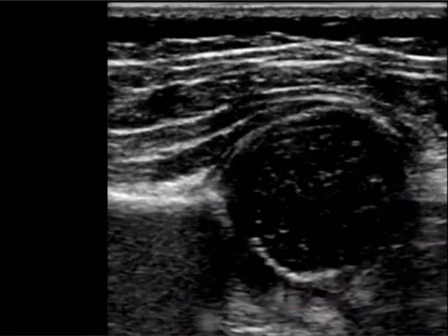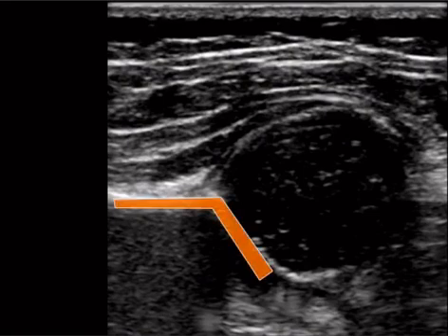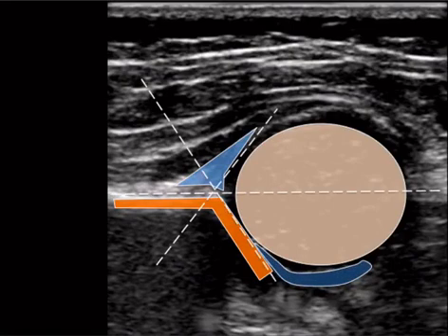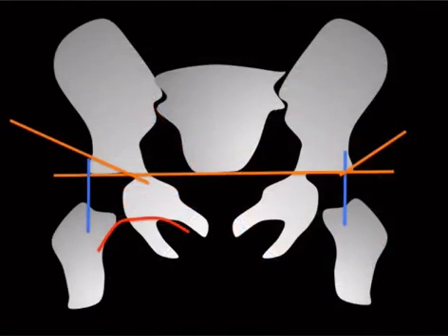Now, another thing that you can do for screening on this is, let's say that the pediatrician did a physical exam maneuver and they heard a clunking noise, and they get these ultrasounds. So you have to do these ultrasounds. So get this anatomy sort of going. And here's a labrum, your cartilage, femoral head. You draw an angle like that. That's an angle. So that's your alpha angle. And that is different than your acetabular angle, which was this angle here.